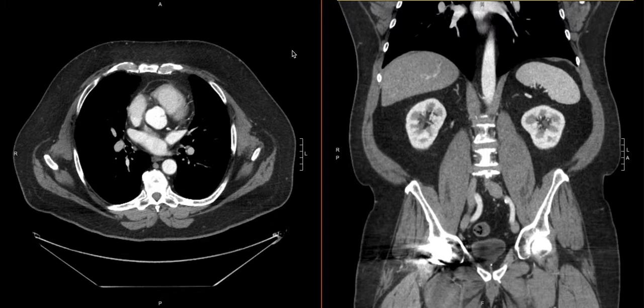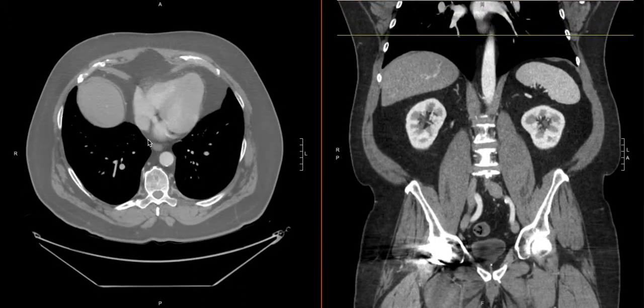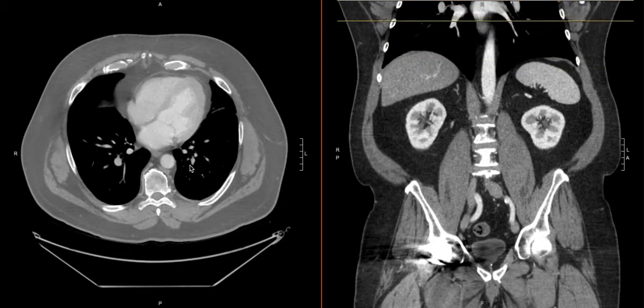Now we start with the abdominal window, but then we're going to do a little bit of manual tweaking of the window, and these are the sections of the pulmonary artery that we have. We just want to put it in a place where we can see filling defects relatively easily. So we'll just start on the right side and trace it out. We're looking here right now, and we'll come back and look at all the branches that we can find.